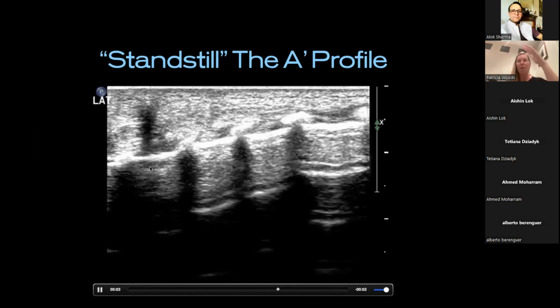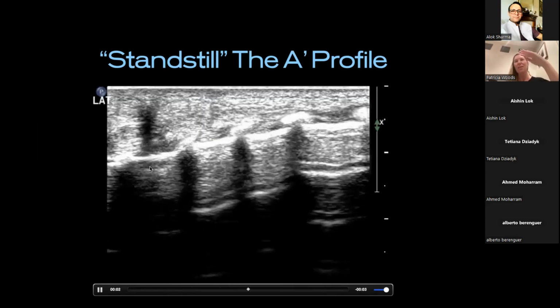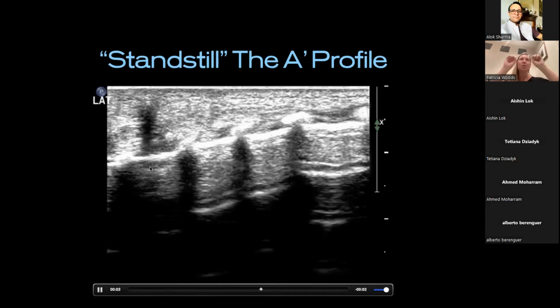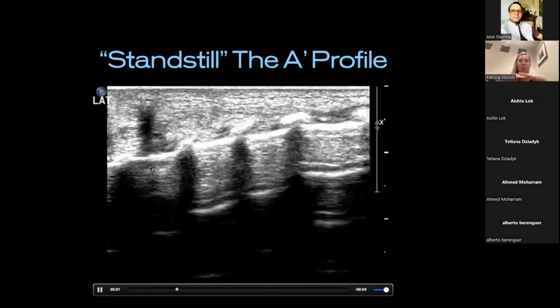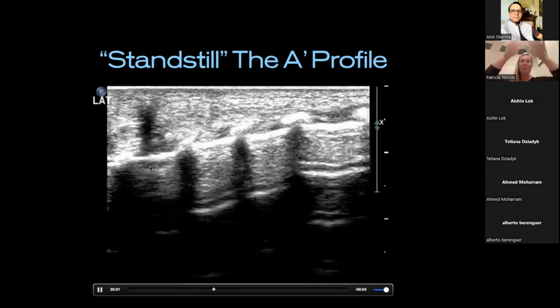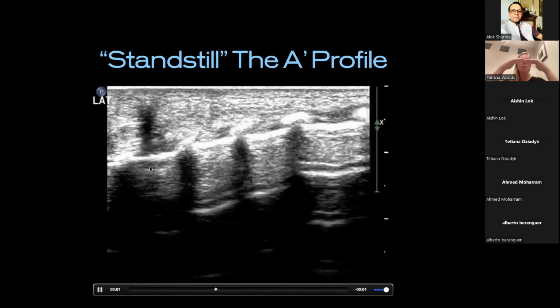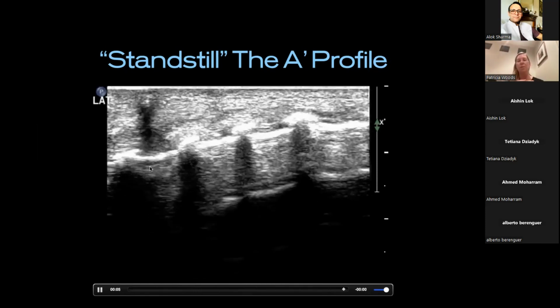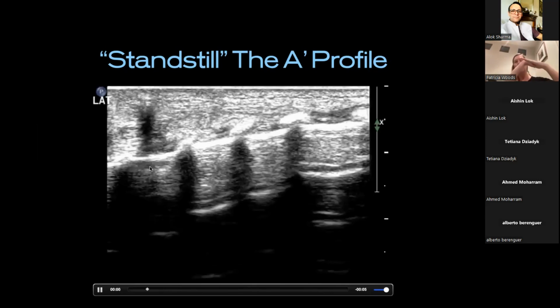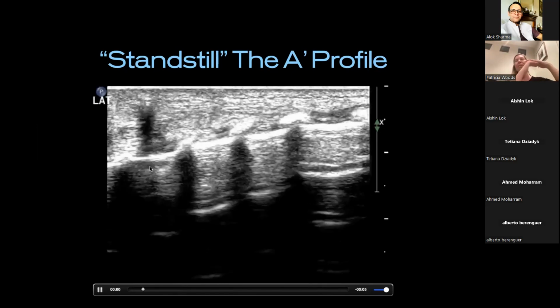Really important now. The actual parietal pleura separated away with the visceral pleura acts like almost a reflective mirror. Okay, reflecting, refracting, those ultrasounds coming from the probe, going through the tissue, hitting that sudden change of interface of surface from tissue to air, bounce away, don't know how to get back to the probe. And you just get this repeated pattern of anything above that parietal pleura below, but absolutely no sliding. You need the contact of the two to produce sliding and the artifacts generated from it, particularly B-lines and lung pulse.